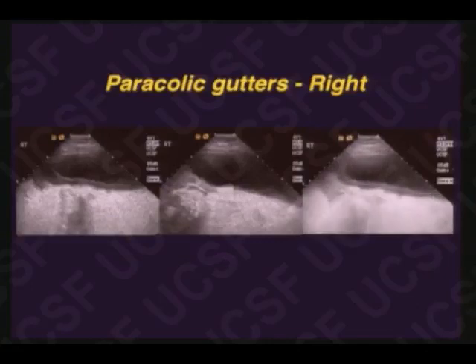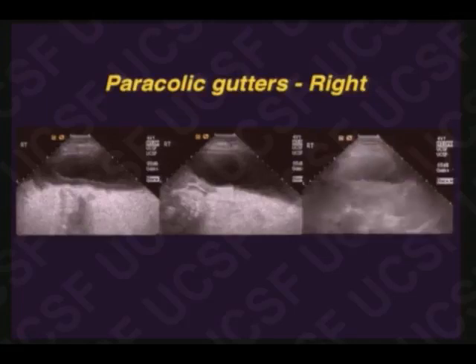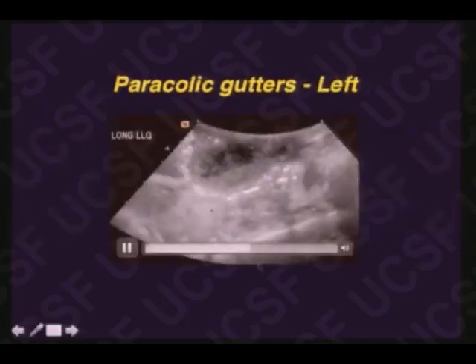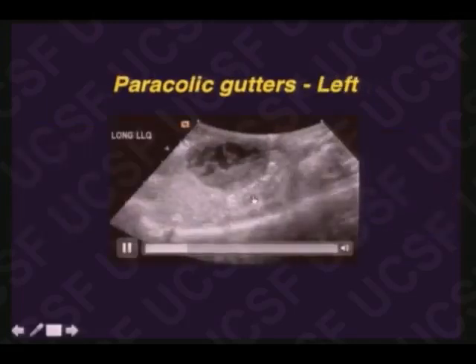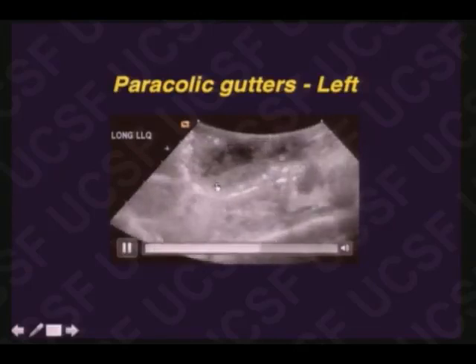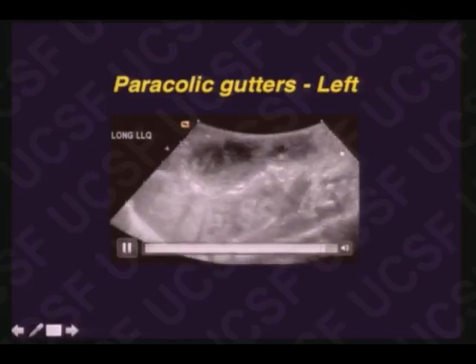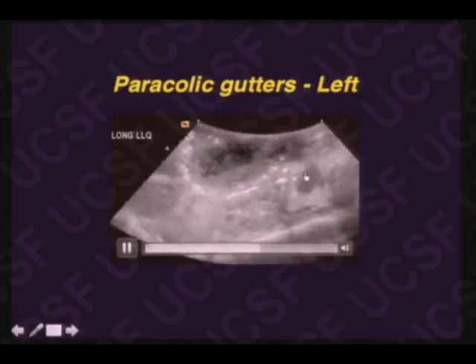Here's a patient with an abscess in the right pericolic gutter, and again, you have to be impressed with that bowel gas. I mean, that is big-time bowel gas, but I'm going to find the abscess in the pericolic gutter. Here in the left pericolic gutter, I don't care about the bowel gas. I'm going to find these 2 abscesses in the pericolic gutter. And again, if that one doesn't drain through that abscess, this abscess won't be drained.